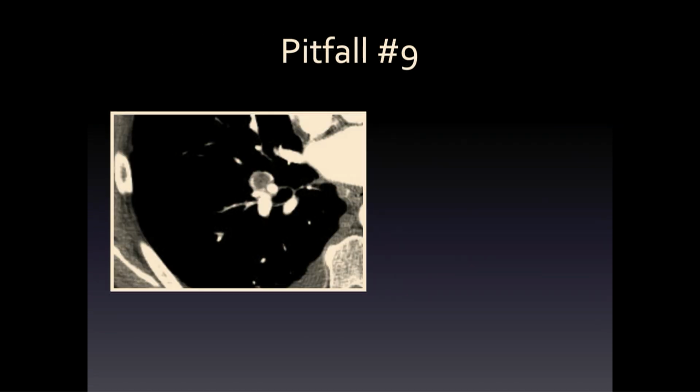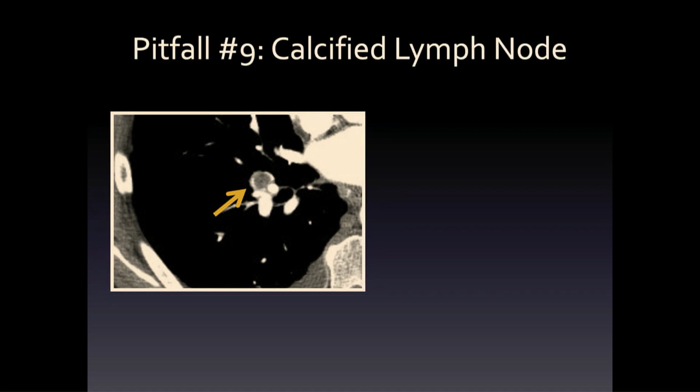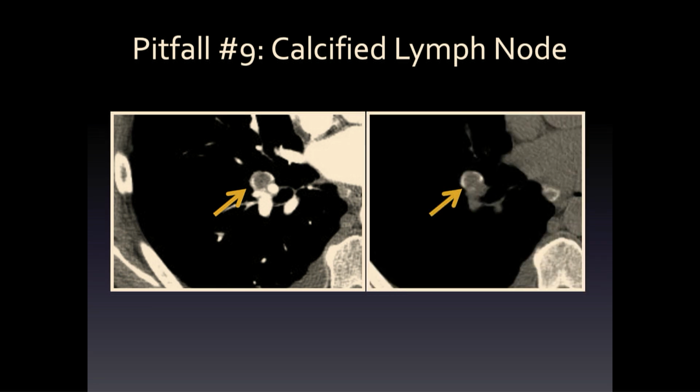All right, case 9. Remember, this one's been pretty tricky. We have low density, high density on the outside. It doesn't totally look like a normal vessel, though. It's not continuous high density. And what was this? It's actually calcification. I think we can get tripped up if we go fast, but of course, if we look closely at the density, is it really contrast? Maybe if we had a non-con, or if we look elsewhere in the mediastinum, we could catch that those were just calcified lymph nodes. But if you're going fast, it could be tricky.